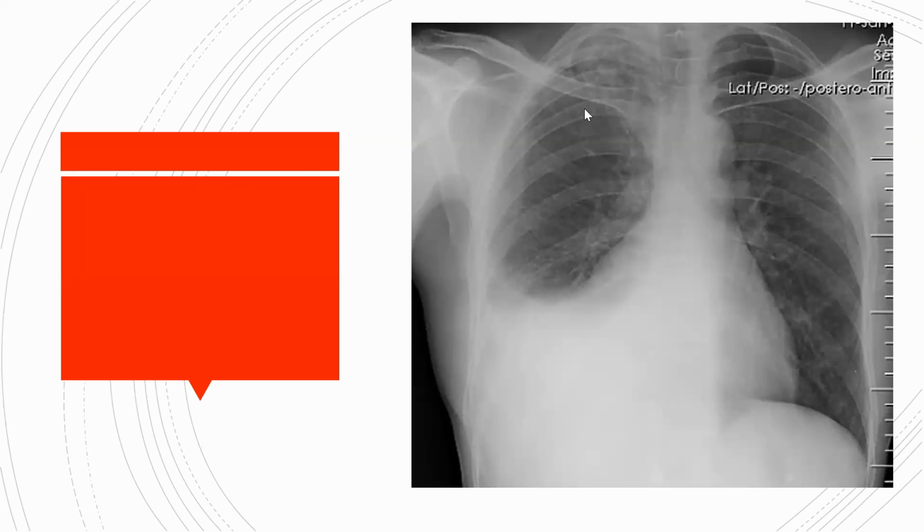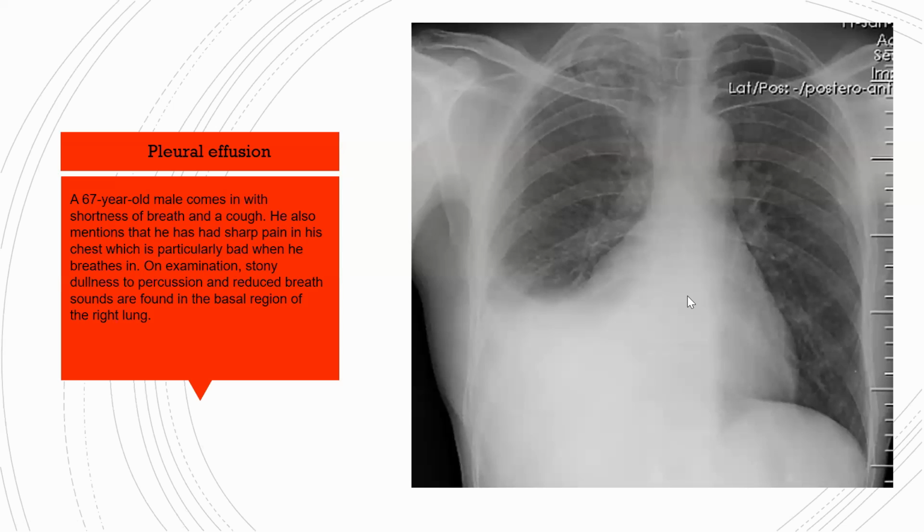Right, so let's reveal the solution. Yes, correct, pleural effusion. So well done the guys who got that. Yes, on the right side, because remember this is the right side and this is the left side of the patient, okay? Cool, pleural effusion. I just put here, this is more for you guys later, a short history of what they might present with, which I think would be really useful for your end of year exams, being like, okay, he has a pleural effusion, reverse thinking, what did he present with, right?